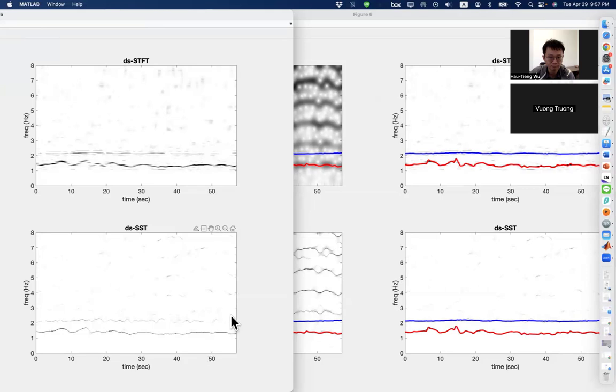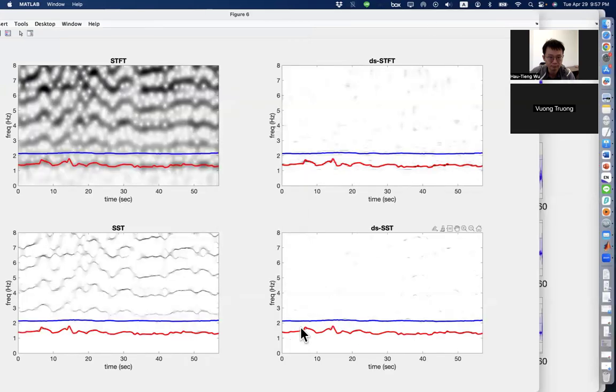And then, furthermore, if you take a look at these R peaks, this maternal instantaneous heart rate, you see there are some small bumpy jumps, which suggests that the R peak detection is not very good. But in this case, as I mentioned, the maternal ECG is still relatively strong, so you don't have too much trouble getting the maternal instantaneous heart rate or maternal R peaks.